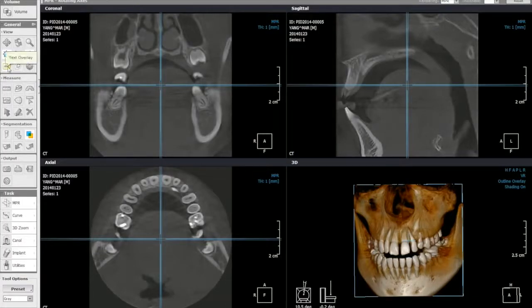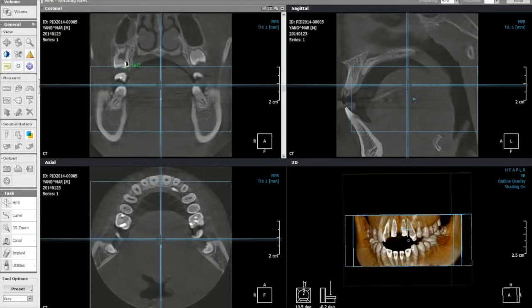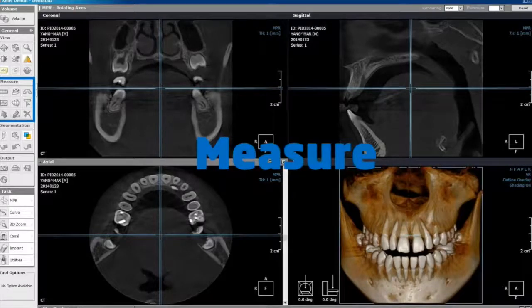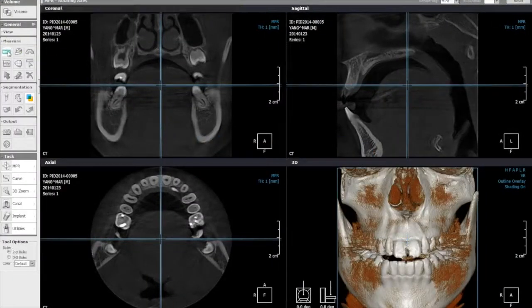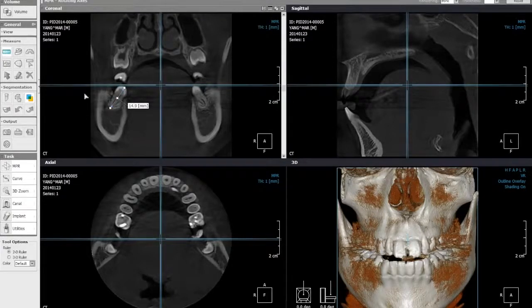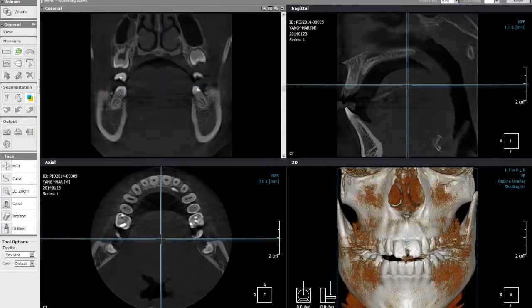Text overlay allows to appear and disappear the patient's information. Finally, use lens to see the density at points where you are interested. The next section is Measure Tools. You have a standard single line measurements, and single left click will start and stop. Also, you can do a multi-line, or tape line. So you can do multiple measurements, and it will give you some total of the line.